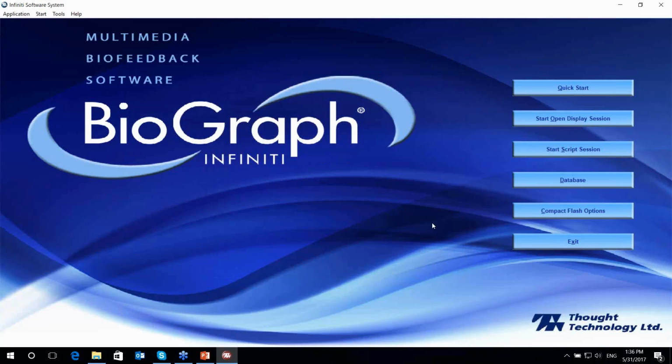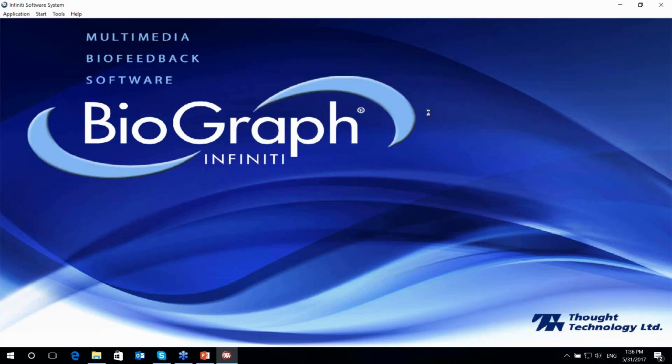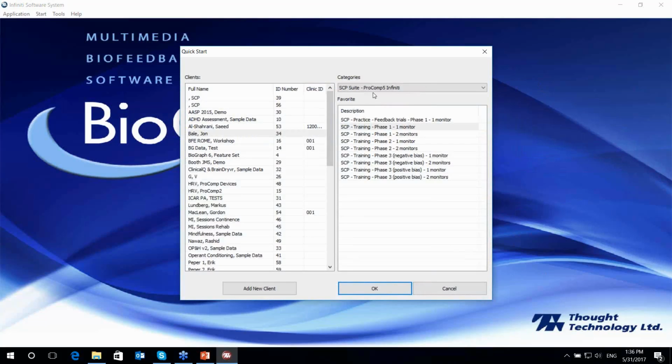Right here at the main menu, you can see towards the upper right, there's this quick start button. And again, just like those icons found on the desktop, these are the exact same quick starts that let you rapidly initiate a session and not waste time navigating the software. Now, the people who ask how to make these quick starts evidently want to add their own. We already provide certain quick starts as default installation packages, and these quick starts are useful. They often represent the most popular and the simplest types of sessions.